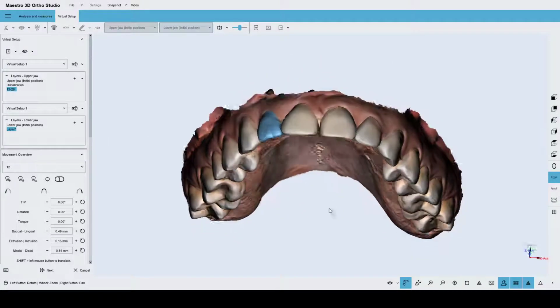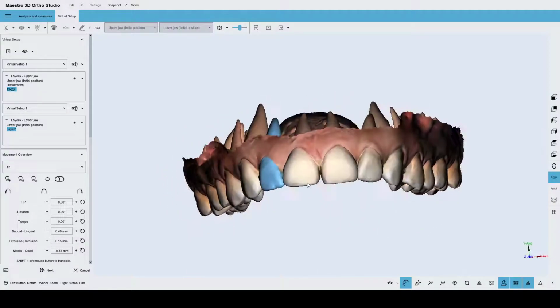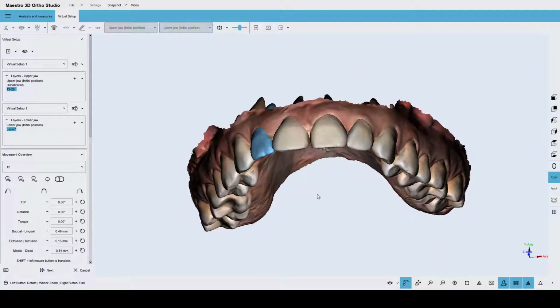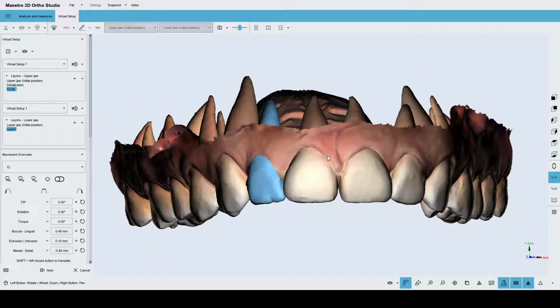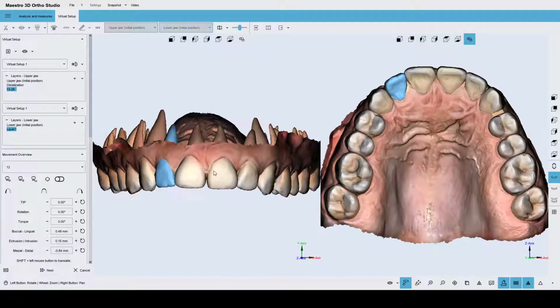Consider that until now I'm working with just one single window. So you see, I'm working with the full editing area, showing just one model from one point of view. It's really helpful sometimes to split the screen, because the same movement that we have performed from a single point of view, I can, in this moment, perform using more points of view.